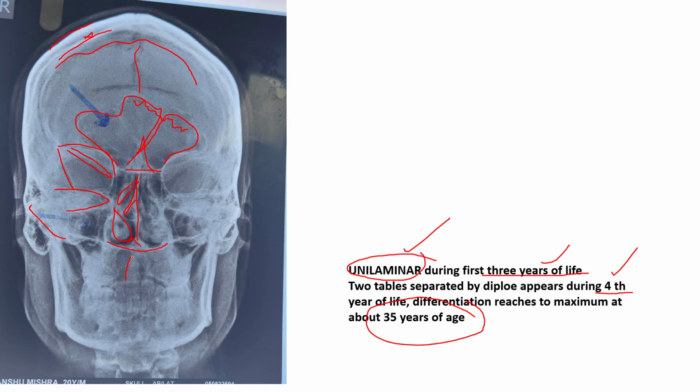Now in the area of mouth, you will see the dens, the part of second cervical vertebra, and here you see the mastoid, and this black area looks black or translucent. This black area is basically mastoid air cells. Here you have this sinus, this is maxillary air sinus, this is maxillary air sinus. Here you see the ramus of mandible, the angle of mandible, the base of mandible.